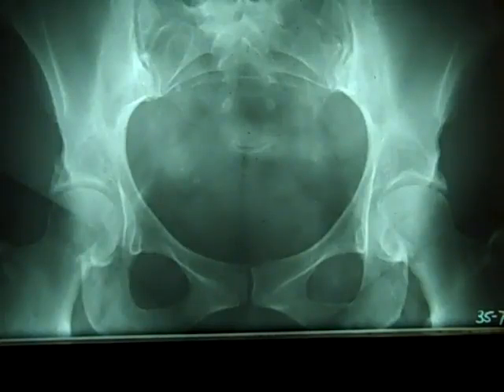My name is Dr. Bradshaw, and this film is intended for the use of my 2612 RAD students, and this is page 8 of structural analysis. The first one on this page is called iliofemoral line. An iliofemoral line, for lack of a better description, is just a weird looking line.